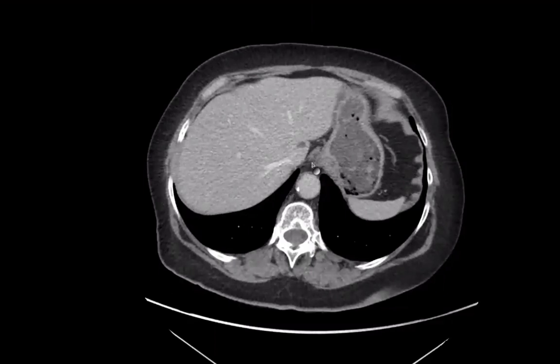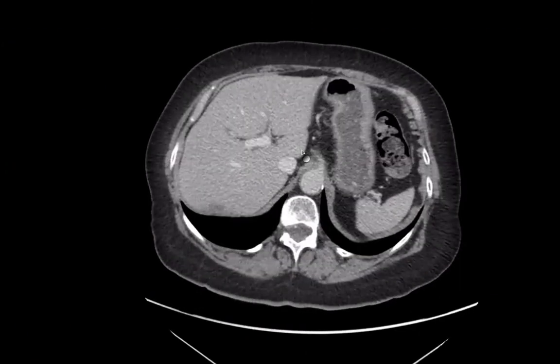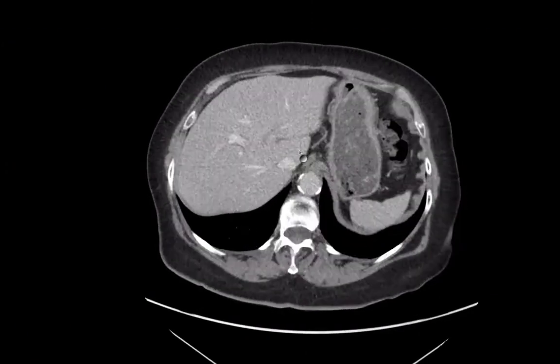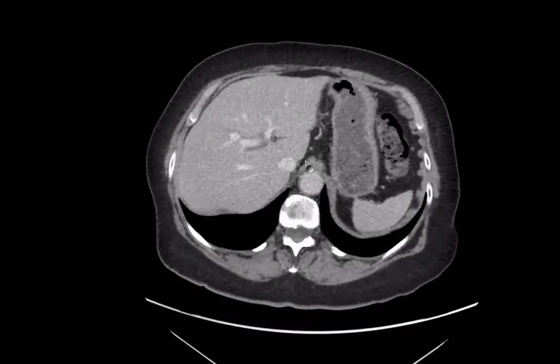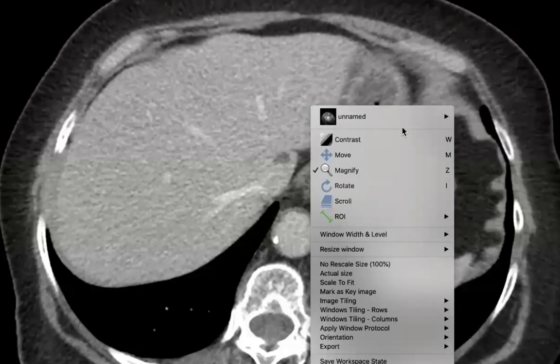What's this? So this is a hypodense non-enhancing lesion. Of course, I would like to check the arterial phase to comment on the enhancement, but this seems to be non-enhancing. With the presence of mesenteric deposits, I would be worried that this might represent another deposit. I will confirm its nature by ultrasound. What is your normal practice? If you saw this in real life, what would you do with this lesion? I usually check first the ultrasound images if they are available.